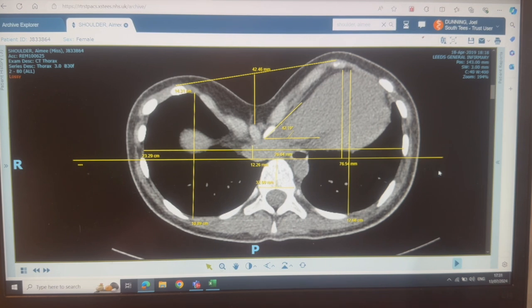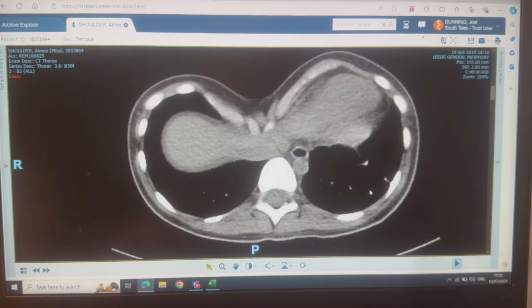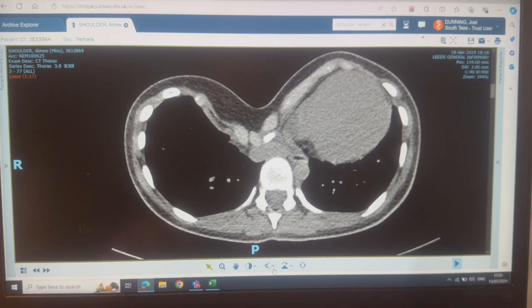And then the reason I put this one up is because of the heart. So here's looking at the cardiac compression index. How are we going to do this? Because that probably is the deepest point. Let's go up and down and make sure. So for this, I would say that's the... I sometimes just drop the line down so I can get it straight. That saves me having to drop a vertical line down here. So that's the width of the heart.